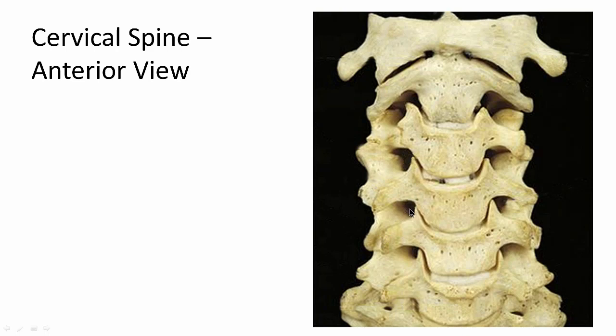And the whole notch, the whole ball of wax, is called the neural groove of the transverse process, and that's for the spinal nerve. What does the spinal nerve turn into quickly here that finishes off in this groove? Ventral ramus.